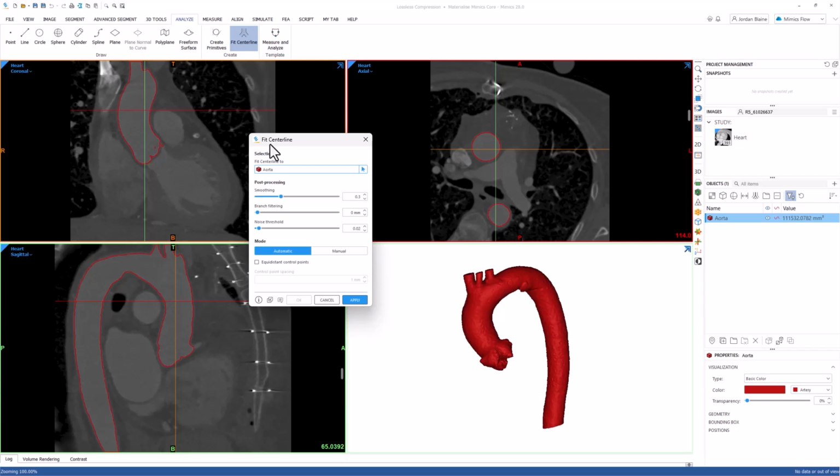Looking at the post-processing parameters, we will first see smoothing, which controls the smooth factor of the centerline. Smoothing will stop when one point in the centerline branch deviates from its original position by a distance greater than the smooth factor times the average branch radius. If that's confusing, just remember that a higher smooth factor results in a smoother centerline with lower variability in curvature. The default setting here is 0.3, which will offer a good balance between precision and smoothness in most cases. In extreme cases, where there are very short turns in geometry, you may want to choose a lower smooth factor.